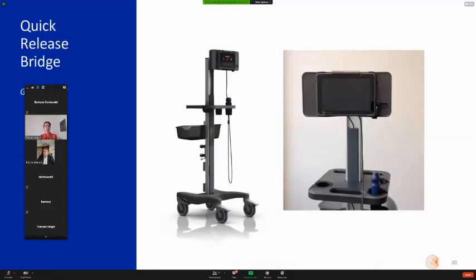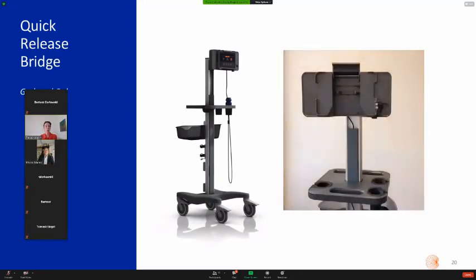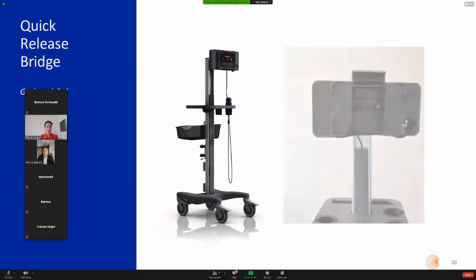And finally, also just to show you that there's a stand available. I know in some hospitals having a stand is a desirable feature, maybe not always to scan on it, but to have a place where it can stay within the hospital.